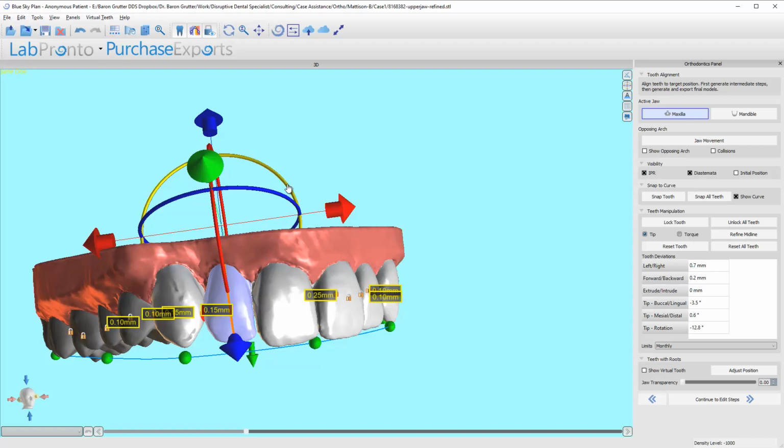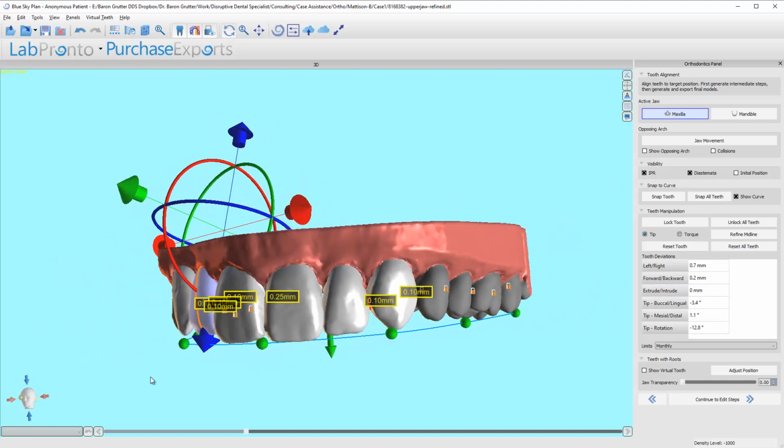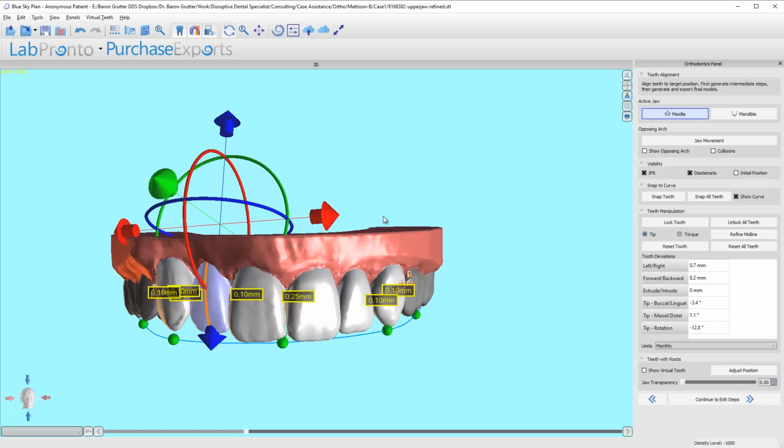because I want very positive contacts. I do not want to run the risk of having open contacts in a case like this. So that's it. IPR wise, I'm good. Again, ignore this 0.25. You're not going to do IPR there.